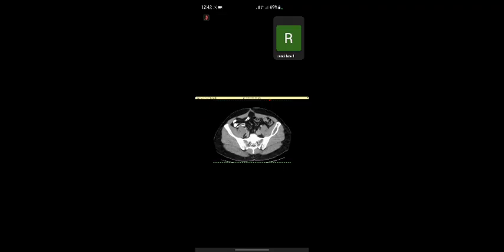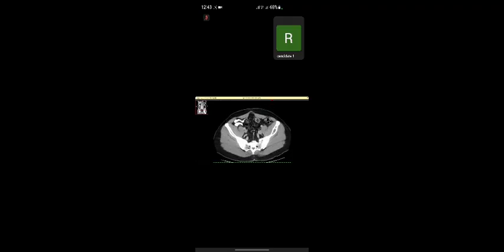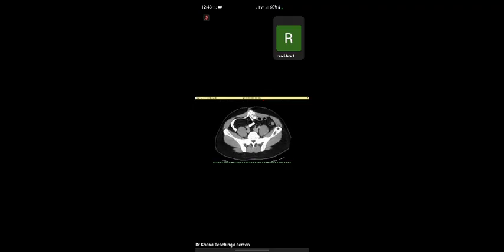So this can be a lytic metastasis, or a plasmacytoma, or else some benign pathology like a simple bone cyst in this location. Given the age of the patient, aneurysmal bone cyst is less likely. GCT is a possibility, but it is more towards the sacroiliac joint and the posterior elements. However, I would still like to see an MRI of this patient for further characterization of the abnormality.